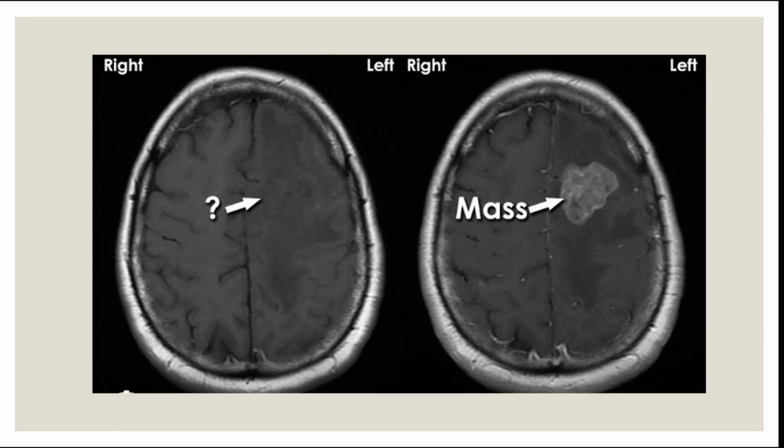So this was an image. The one to the left was an image without the contrast media, so you couldn't really see the lesion. After the contrast media, it became more hyperintense and you can see the mass.